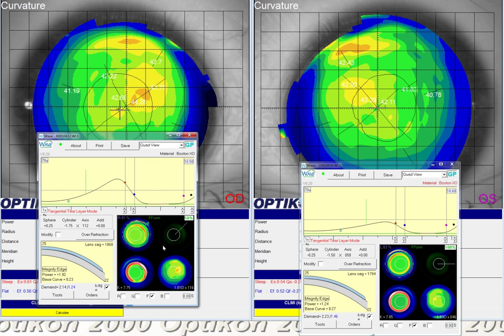This way, in this meridian, the back edge of the reverse curve here at the blue control point will match up with the optic zone in the opposite meridian, or the meridian 90 degrees away.